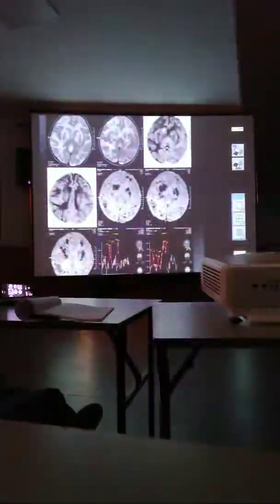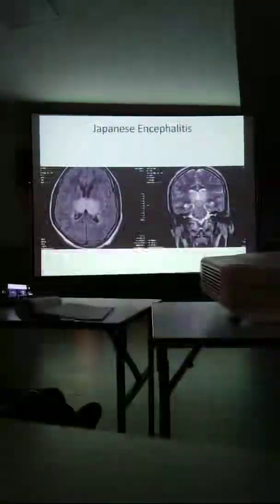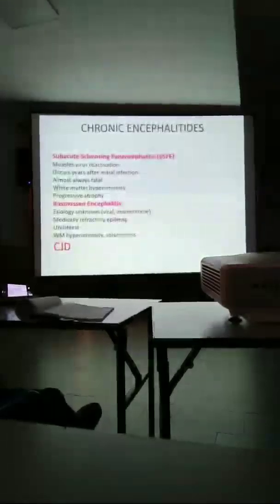Sometimes necrotizing encephalopathy also can come. This is one of the features. You can see acute necrotizing viral encephalitis because of influenza. So two spectrum of diseases. And if you are seeing Japanese encephalitis, it is bithalamic involvement. Classical appearance of bithalamic involvement in Japanese encephalitis. So up to now, you have seen herpes, Japanese encephalitis, chickenpox encephalitis, and influenza encephalitis.